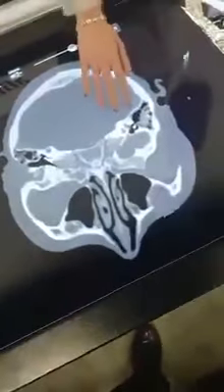And what's most interesting to me is you can load in your own patient's CT or MRI scans, and from there you can get a 3D model of what you're seeing. So here we have a post-operative scan of a patient with a brain aneurysm, and this is the actual CT that was provided. You can go ahead and slide through the CT and see exactly where the clips were placed as well. So if I go down here, it'll show where it is.